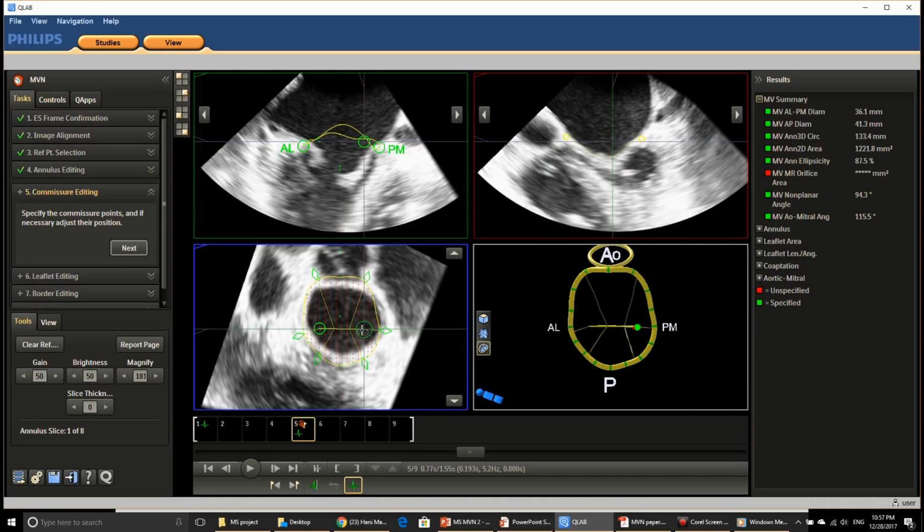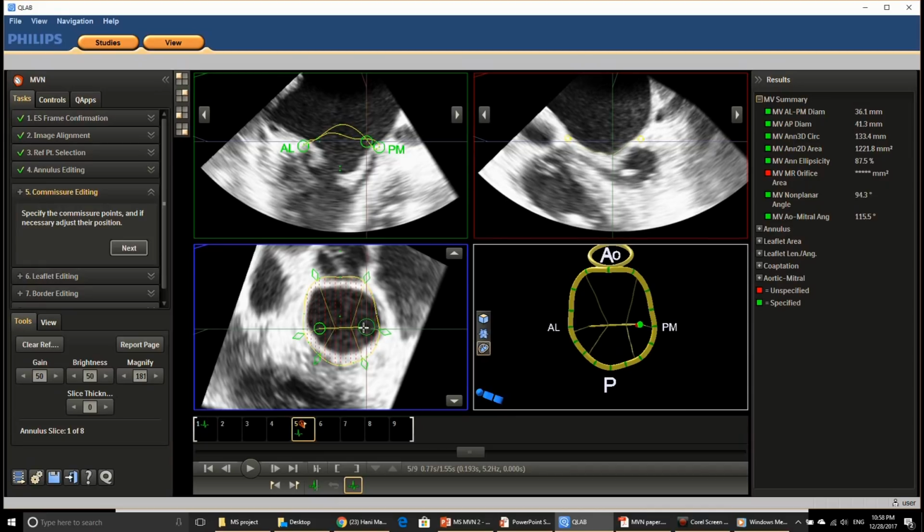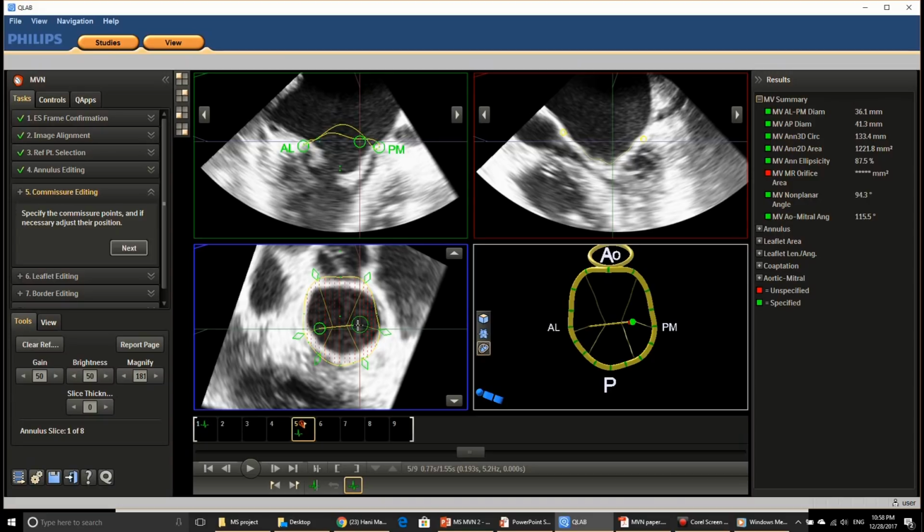So it will turn green, and then I will go back laterally to the annulus, and then I will go medial. I'm looking now at the right upper quadrant. Okay, still fused, fused, fused, still fused. Once they separate, this is the separation.